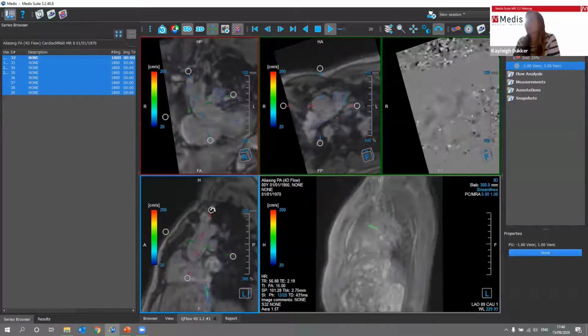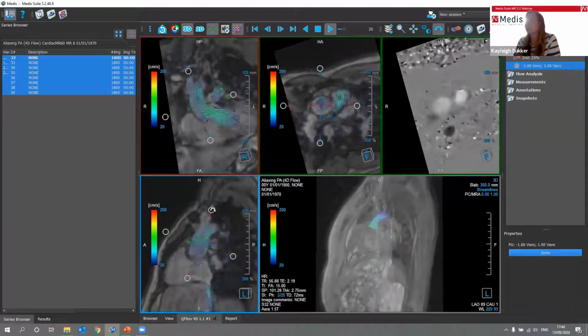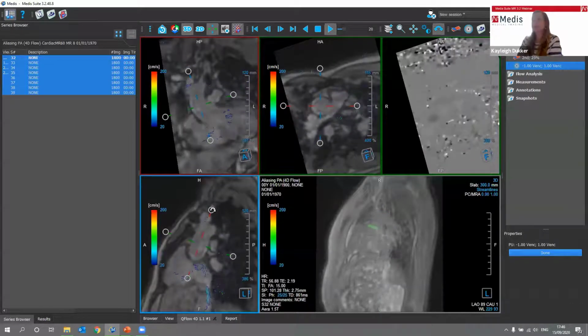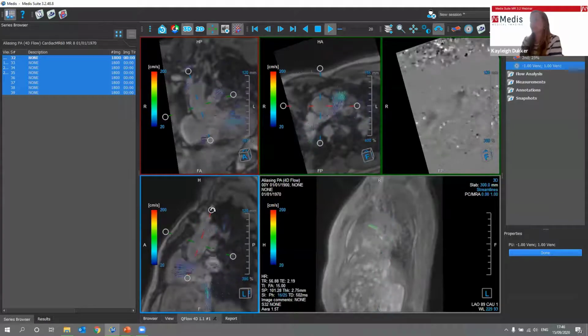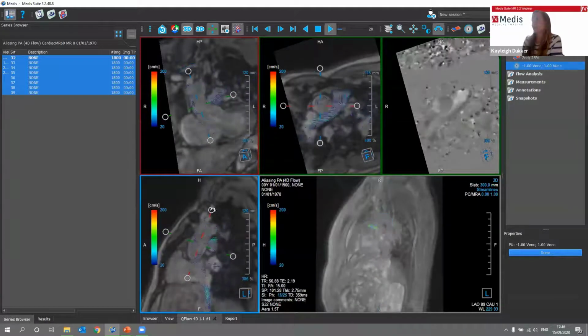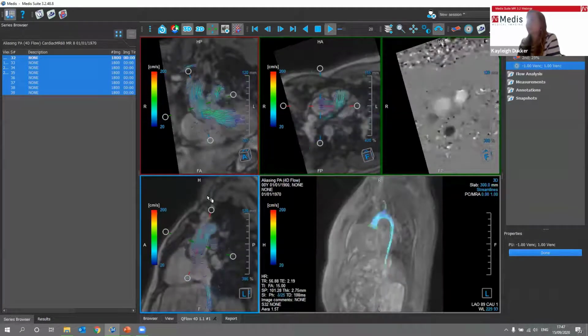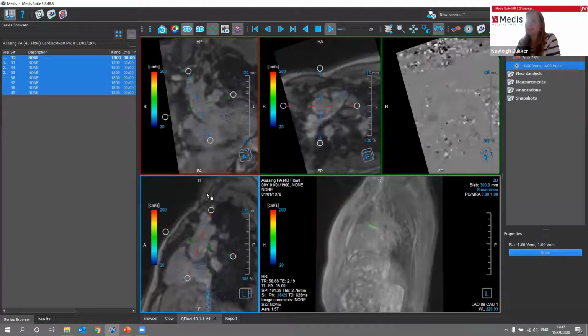For a 4D flow, they advise to do at least a second degree and prefer a third degree. It will take a bit more time to run the algorithm or to analyze it. So that's a bit depending on your wishes, if there is a time, but yes, we advise to do a third degree for 4D flow cases, especially for Siemens or GE datasets.